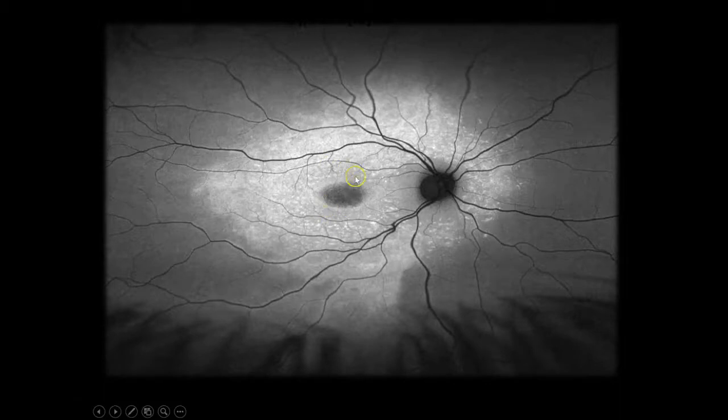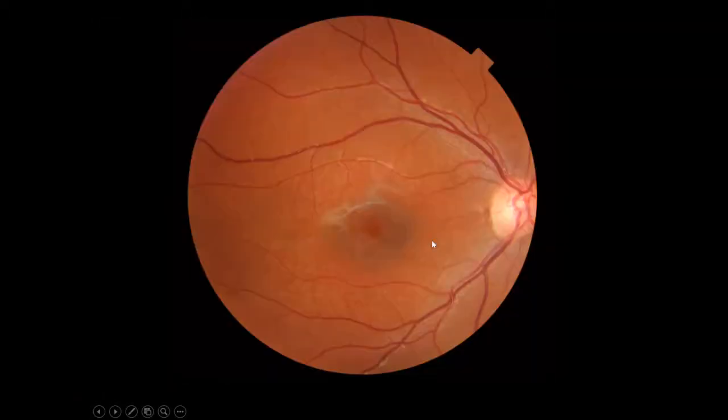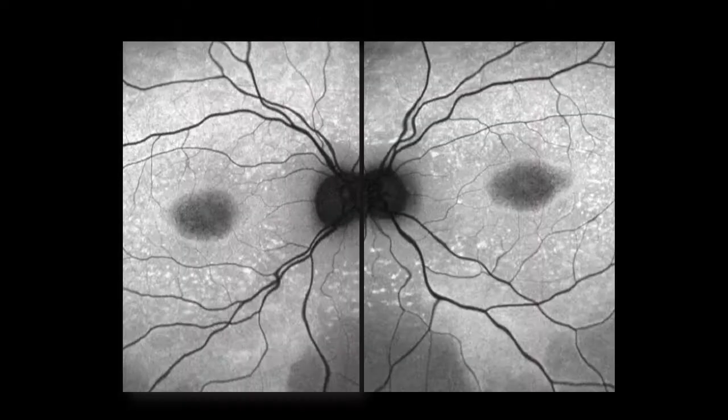In addition to the area that's hypoautofluorescent, you can see there are large zones of hyperautofluorescence. So these are zones where the retinal pigment epithelium is sick or metabolically active. The dots, spots if you will, or flecks, are suggesting a diagnosis, suggesting that this youngster has Stargardt's disease. He has a maculopathy and has flecks, and that's very typical of Stargardt's disease. Again, you may not see it in color, but you can easily see it in autofluorescence.